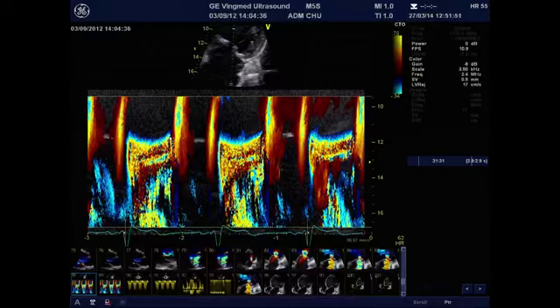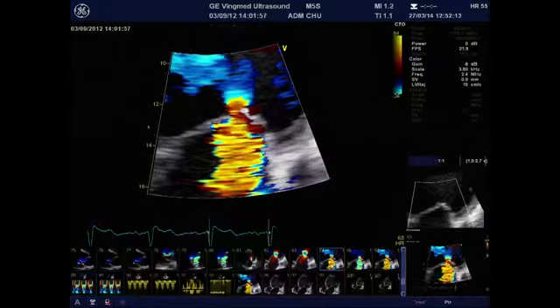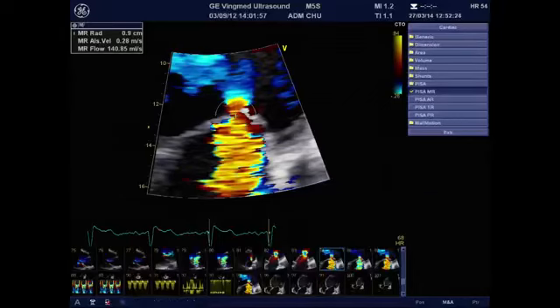And in this kind of patients, it's very clear that you have an early peak, a late peak, and a mid-systolic decrease that is often observed in patients with secondary MR. And this is called a biphasic pattern. And what we do in practice, we just measure here in the mid-systole the PISA radius. And this will be done in this image where we need to measure the PISA. So we will measure the PISA radius from the regurgitant orifice plane to the maximum, so this means the first aliasing, and we have here the PISA.